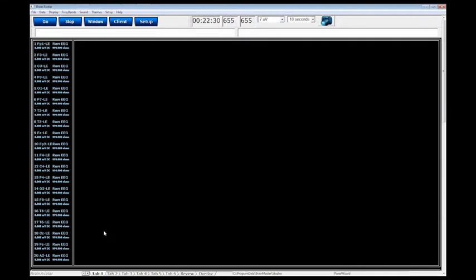And renaming the tabs is actually a fairly simple thing. You're going to go right down to one of your tabs located right at the bottom, and you are going to double-click the tab. And it's going to turn it blue like this and put in a cursor. So from here, I can now type in training, because this will be the tab I'm going to utilize for the basic training that I'm used to on this screen.